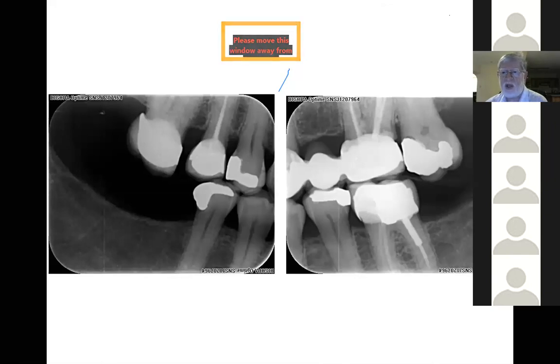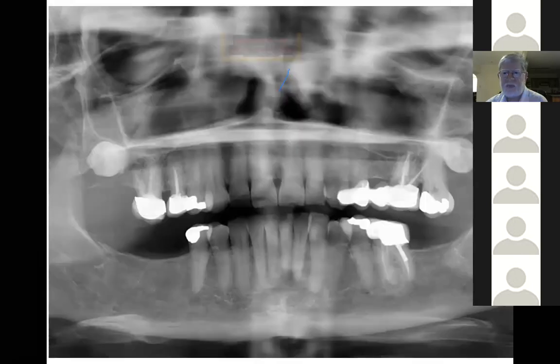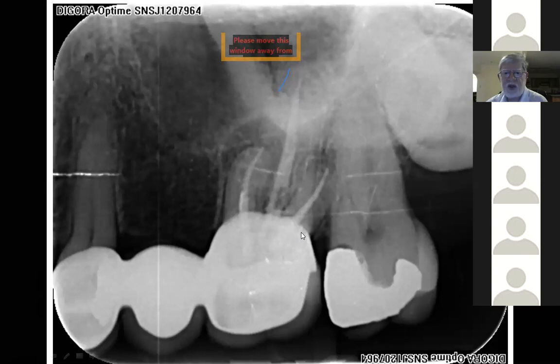We'll be looking at a periapical in the next radiograph of this bridge across here. So we've got an OPG taken. You can see again, here's a wisdom tooth that's rotated quite markedly, that's leaning back quite markedly. And we've got periapical pathology there, we've got periapical pathology there, and there we are. So now, this is something that's impacting quite severely on this bridge.